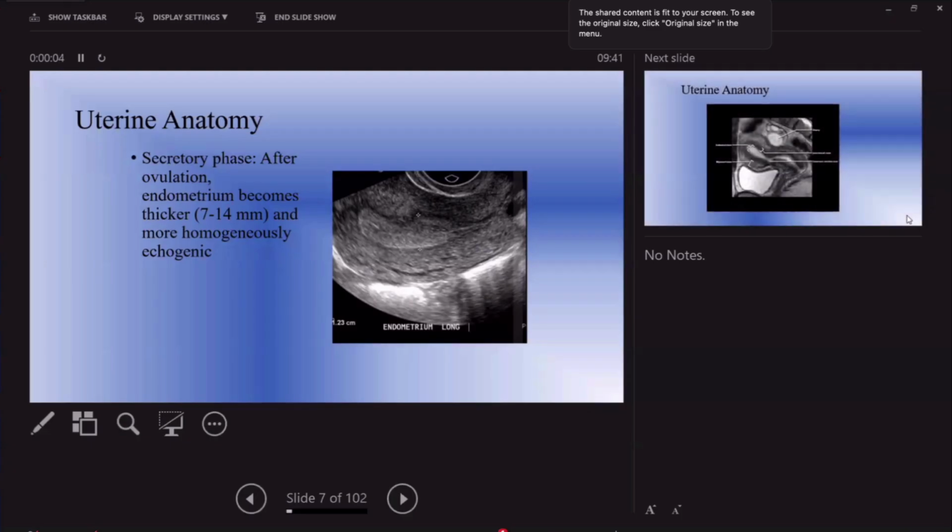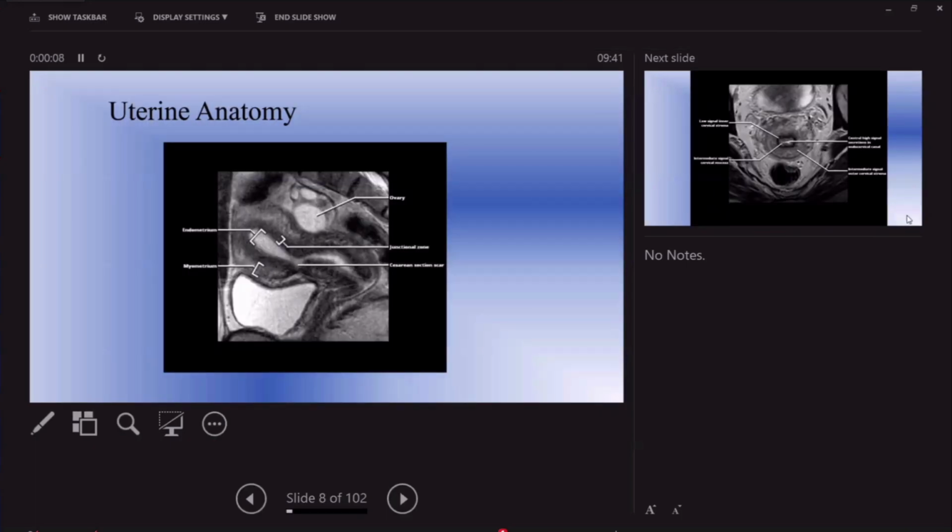Moving from here into the uterine anatomy, looking at an MRI. Very similar appearance. However, with MRI it is extremely crucial that you understand the junctional anatomy of the uterus. When I look at a mid-sagittal image, and this would be really your image that you want to look at whenever you're evaluating any pelvic abnormality or female pelvic cases, the first thing I look at is the endometrium.